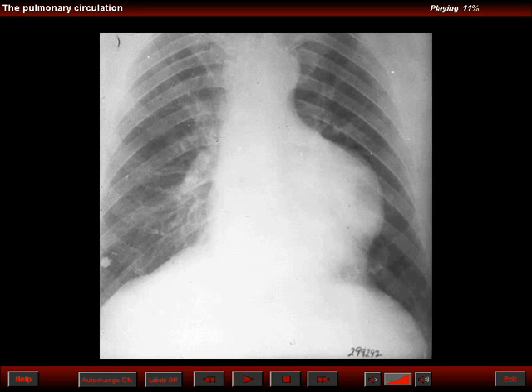Another cause of a bulge along the left heart border is a pericardial cyst, as demonstrated in this patient. Echocardiography would be the procedure of choice. Masses of the mediastinum, like thymic lesions, can appear close to the heart and simulate a bulging pulmonary trunk.